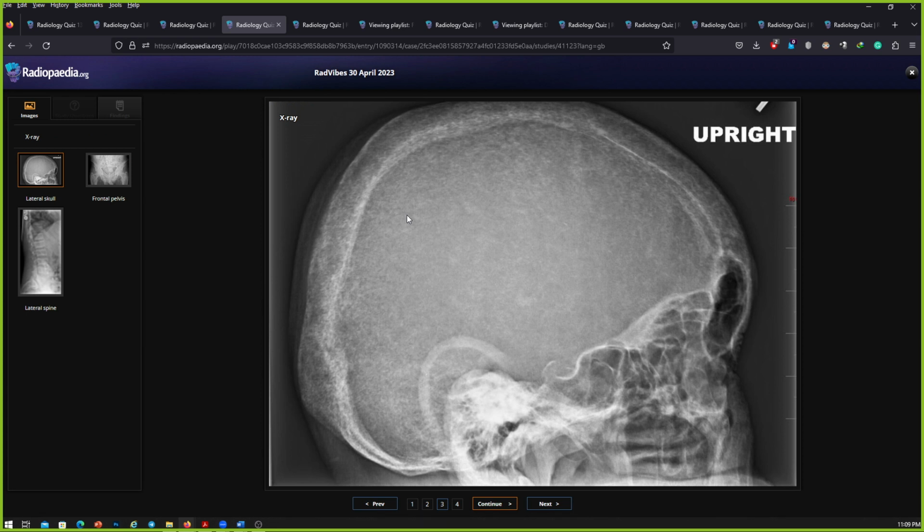Okay, so this is the lateral skull X-ray for the same adult patient, where I can see multiple lytic lesions involving the skull vault, which are small in size, and they resemble the salt and pepper appearance, which indicates hyperparathyroidism secondary to renal osteodystrophy that's causing the super scan. There is calvarial thickening as well, which could be due to treatment.